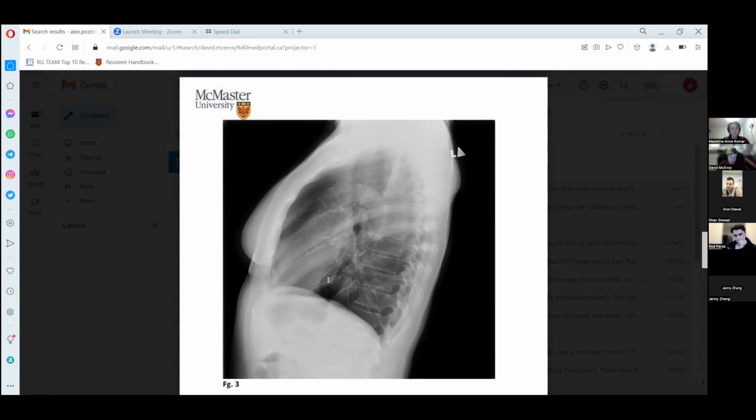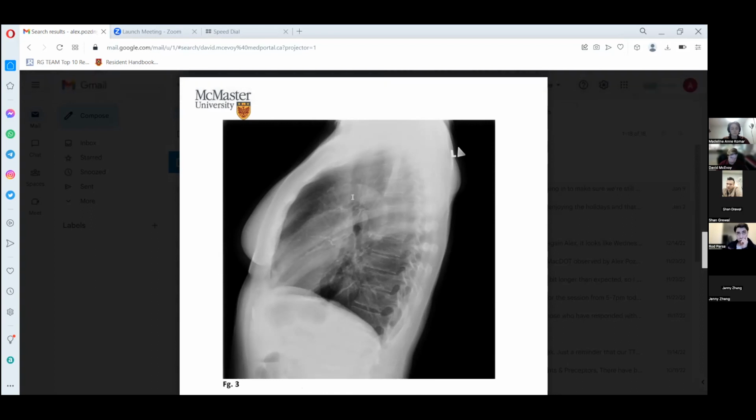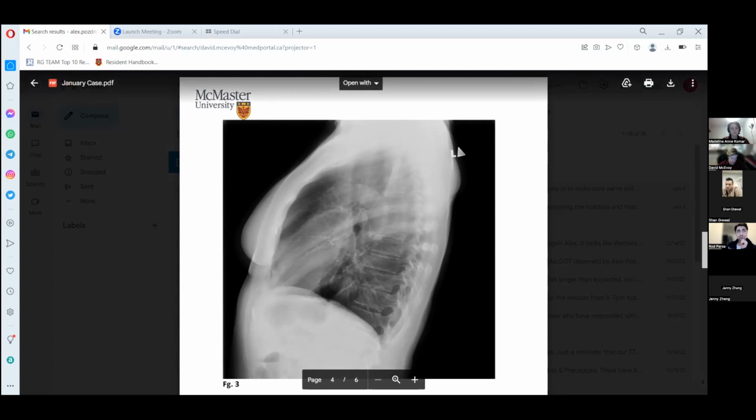the cardiac silhouette, that includes also other structures. You can see fairly well the aorta here, how it takes the turn with the aortic arch. You can also see the hilum that essentially contains the pulmonary vessels, like the pulmonary artery. You see it very well on the lateral view. The lateral view is really good for the thoracic vertebral bodies. You can spot lots of abnormalities on lateral view, and you can see very well the pedicles, the spinous processes and the transverse processes.